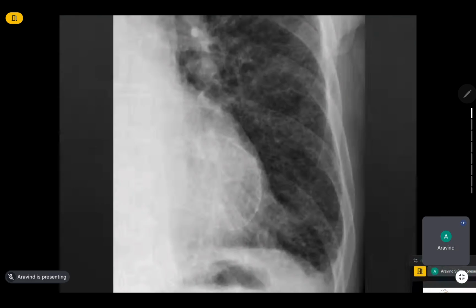It is bulged slightly. Here you can see a calcified margin, the eggshell sign, a calcified margin of the left ventricle. It is indicative of left ventricular aneurysm. In any chest X-ray, if you see a calcified ring-like structure like this in the left ventricle, it is indicative of left ventricular aneurysm.